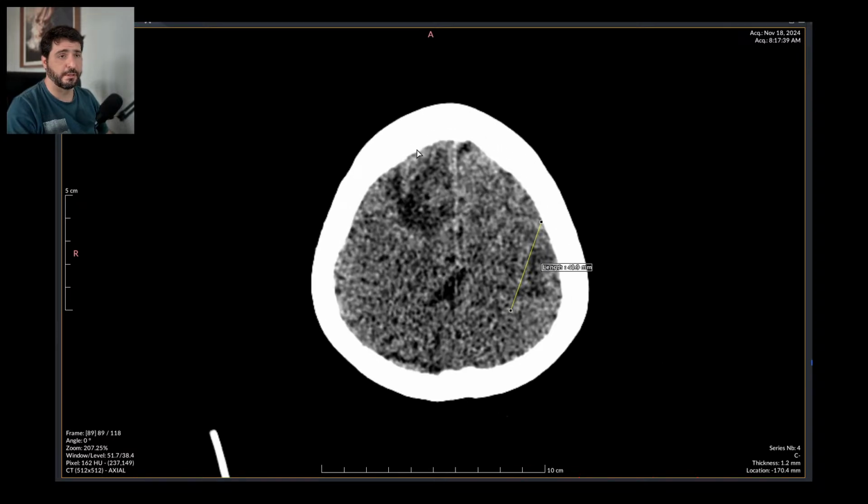I suppose as soon as they do a proper exam on this patient, she is going to have a very, very scary conversation with her referring physician. I'm just going to report it and suggest they should get an MRI with contrast enhancement.